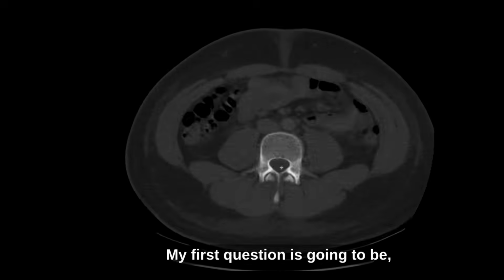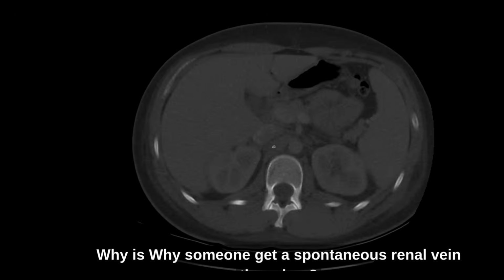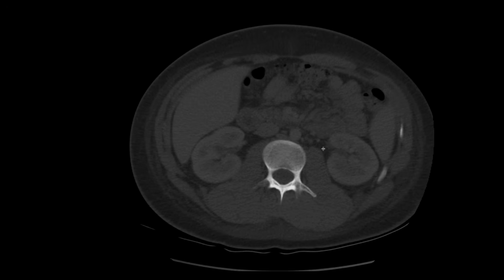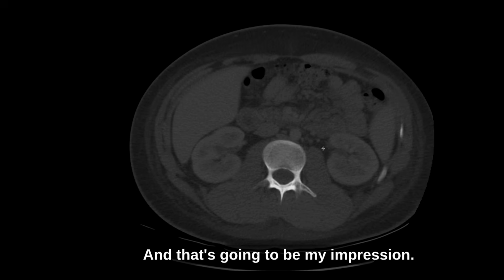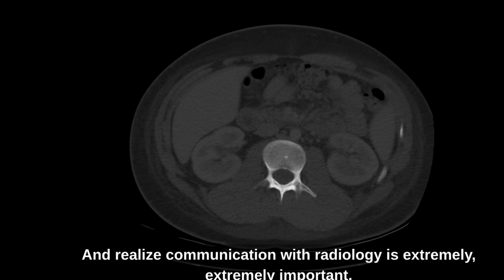My first question is going to be, hey, does this patient have nephrotic syndrome? Why does someone get a spontaneous renal vein thrombus? So we'll talk about that in a follow-up episode, but be thinking about that. And that's going to be my impression. This is going to get a phone call. This is an unexpected finding, and realize communication with radiology is extremely, extremely important.